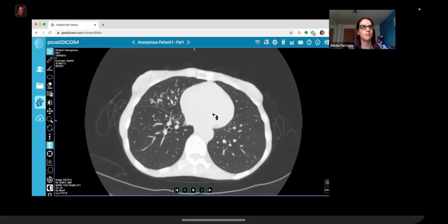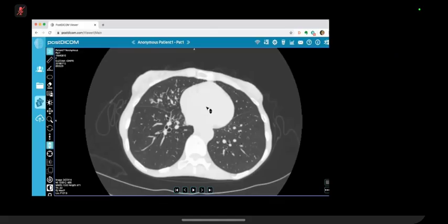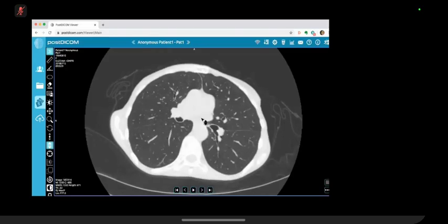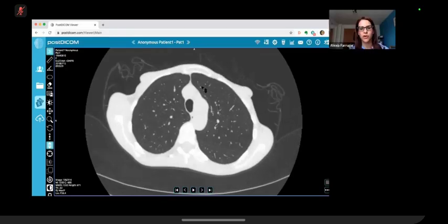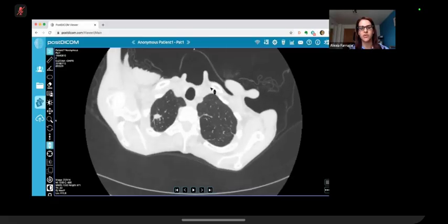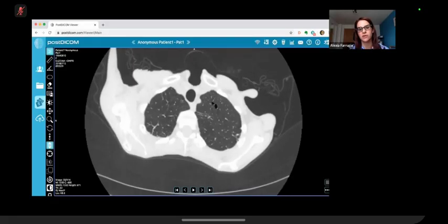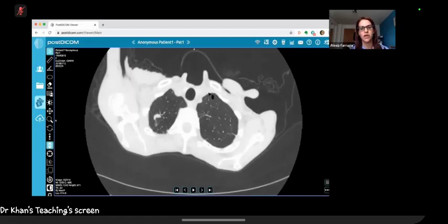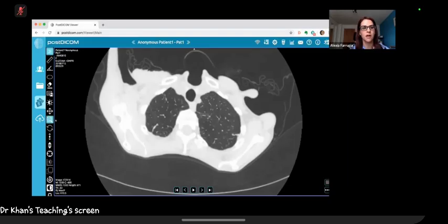So is the lung mass in the apex a separate pathology, a cancer? That we are following up. Yeah. Okay. Because of her history of COPD and because of the appearance, it's rather spiculated. So she's being worked up for that.